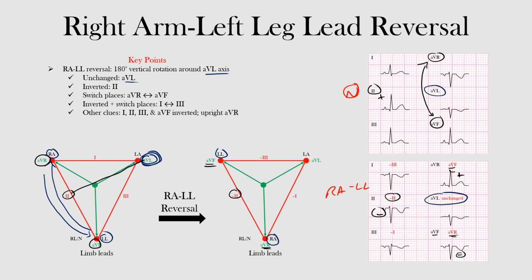Now there's another thing that you should know here, which is that leads 1 and 3 will switch places, and they'll also become inverted.